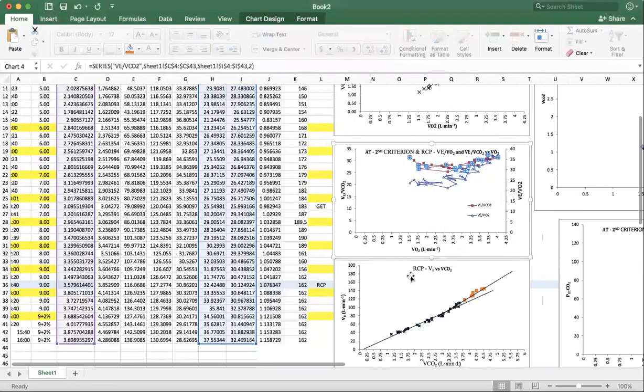And click OK. Again, now you're going to see those same squares with selection boxes showing where all the data is being gathered from. If you click off that graph and select the blue series, now you'll see that alternative column of data.